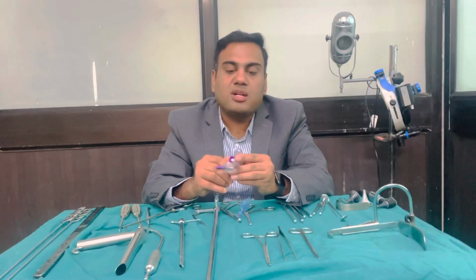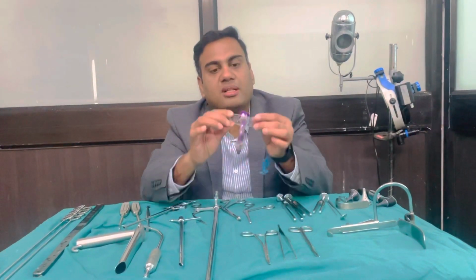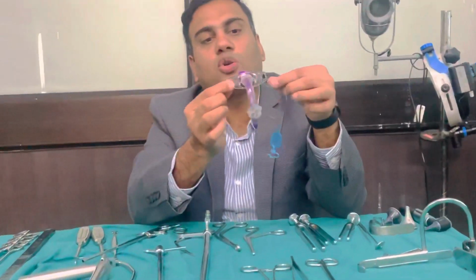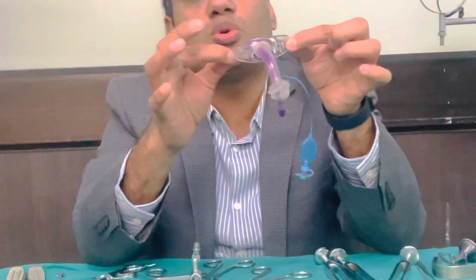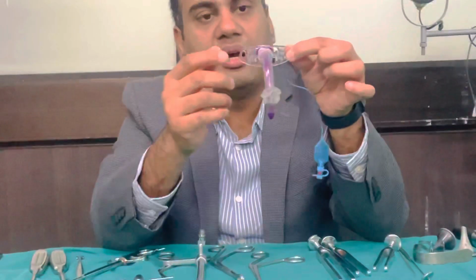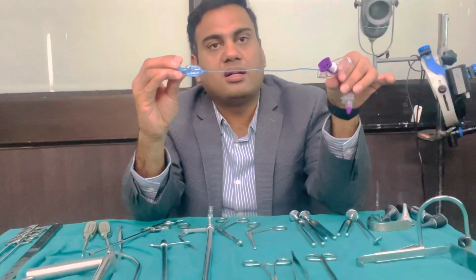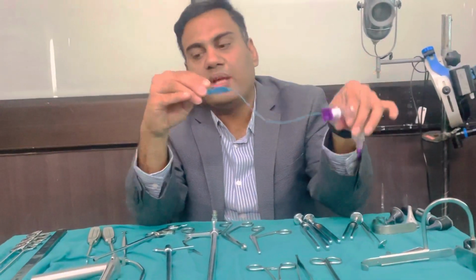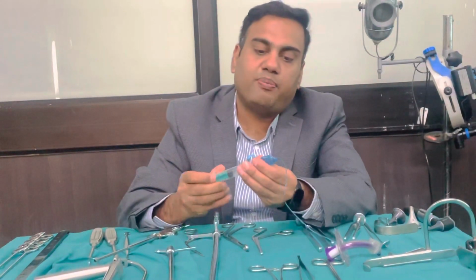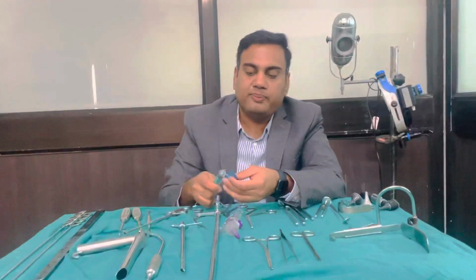Now, first of all, the parts of this tracheostomy tube. This is the flange. This is going to stay on your neck. This is going to stay outside the body, and there are two holes on the sides of it, which is to tie or fix this tracheostomy tube either with a suture or with a ribbon gauze. The other part is this blue colored bulb that you can see. This is used to inflate using air. So if you can see, I would like you to come and take a close-up of this.